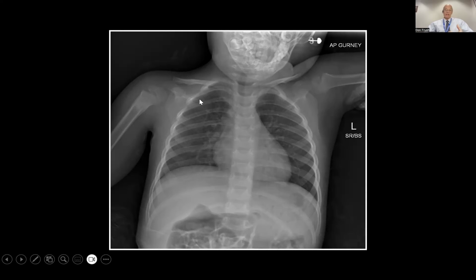You might just say near drowning, we want to make sure the lungs are okay. Once you do your primary survey, lungs are fine. Hey, this kid is going to do okay. You still have to have those 5 checklist areas that you look at. And now you have to be suspicious because you have what is a subacute fracture here in a child with near drowning, and you have to really worry about supervision, non-accidental trauma, things like that, and that needs to be part of the conversation.